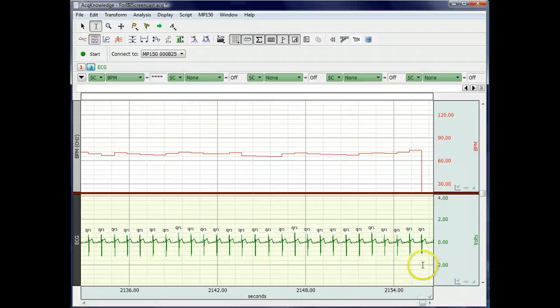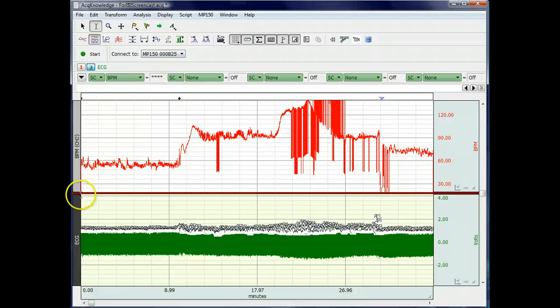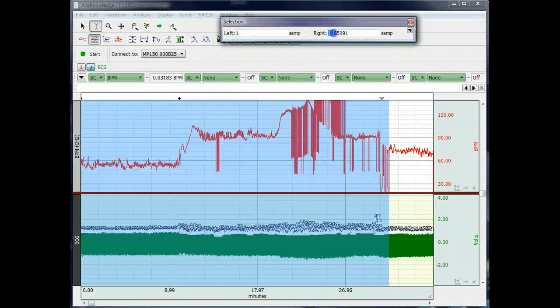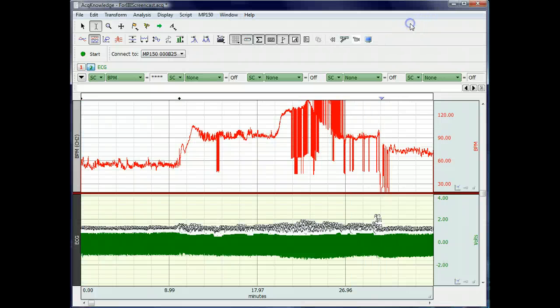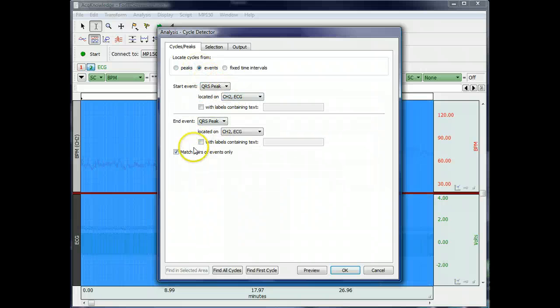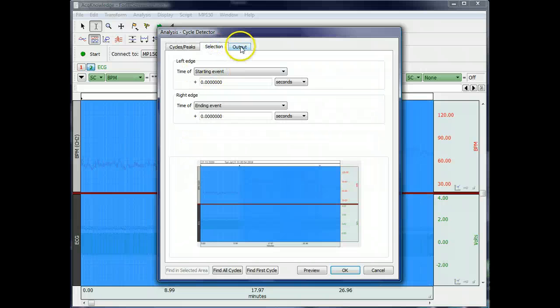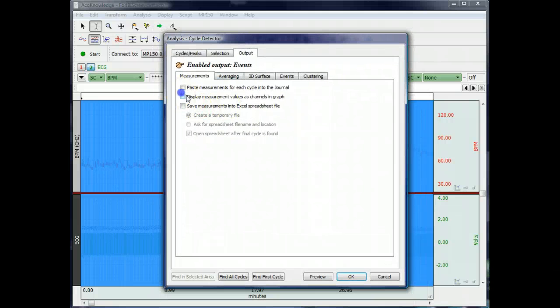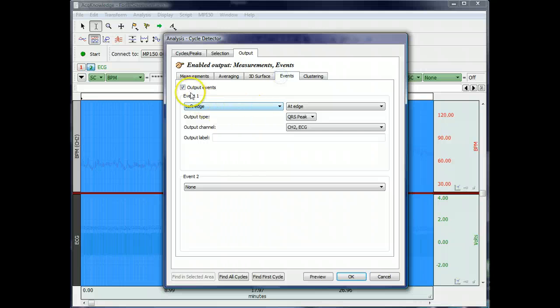Okay, so now, yep, that's the end. All right. What we can do, go back to the beginning of the file, Control-Shift equals to pull up the selection palette. Call up FineCycle, we're looking for events now. Okay, match pairs, looks good. Yes, still the same measurements. There, turn this off.